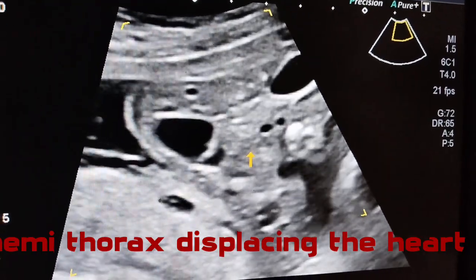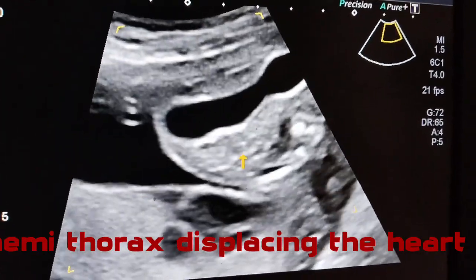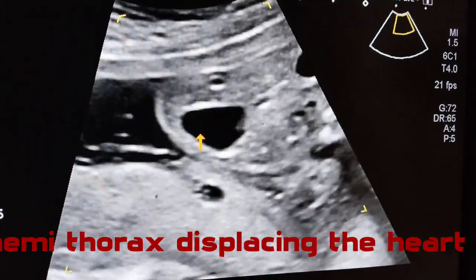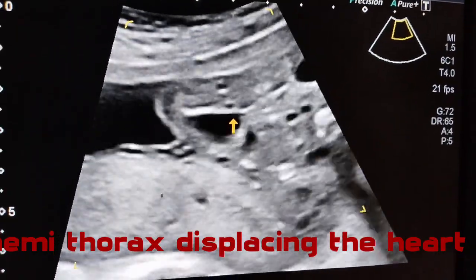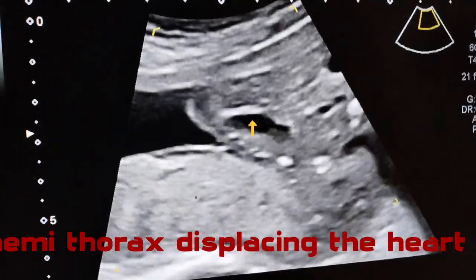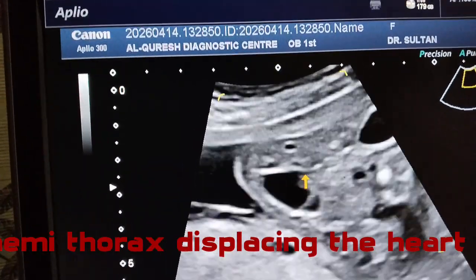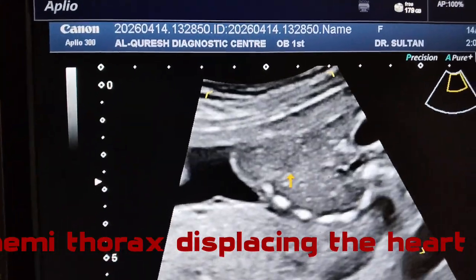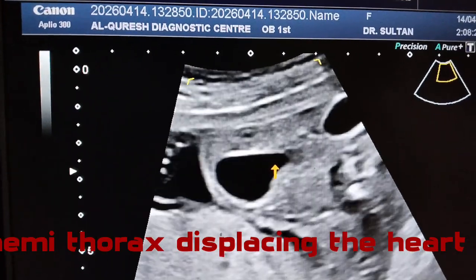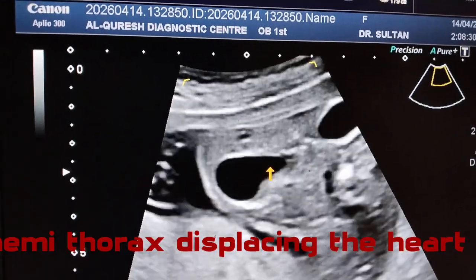Here the loops are collapsed, so we can exclude the duodenal stenosis. Another is the annular pancreas, in which pancreatic tissue externally compresses the proximal duodenum, but there is also partial obstruction, so we can appreciate the fluid or the gas in the distal loops.